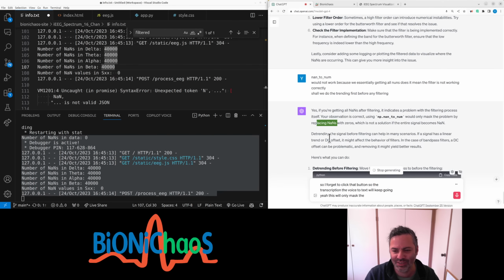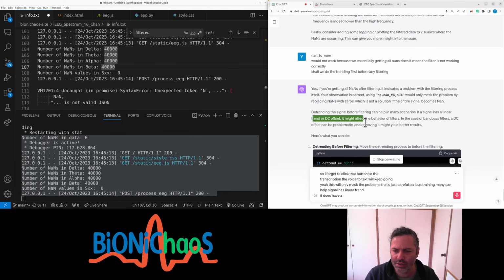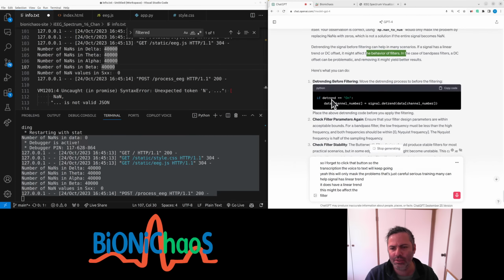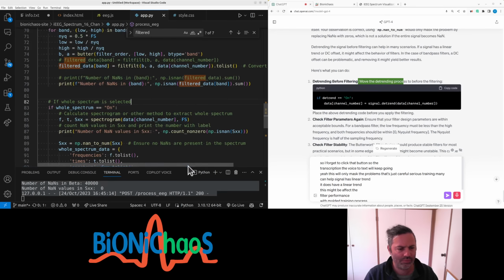Yeah, let's just get all serious. The detrending might help. Signal has a linear trend. It does have a linear trend, and this might affect the filter performance. Remove the trend in the process. Right, so we detrend first. Let's see.